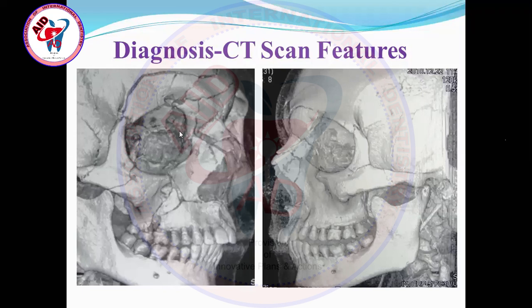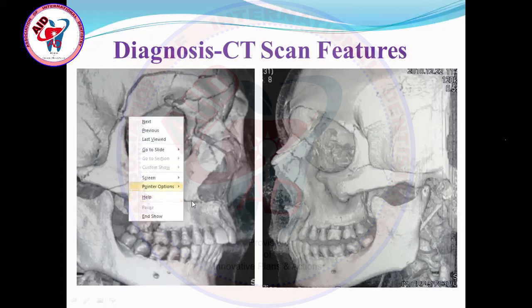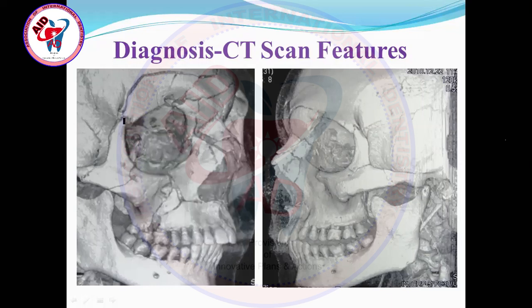Like here in this scan, there is this low level Le Fort 1 fracture. There is Le Fort 2 fracture also, and there is zygomatic bone fracture. Relatively, in the body of the zygoma, there are fracture lines, but these are simple cracks or undisplaced fractures. And there is slight displacement at the frontozygomatic suture also. I'll point it out with this colored pointer. At the frontozygomatic suture also.